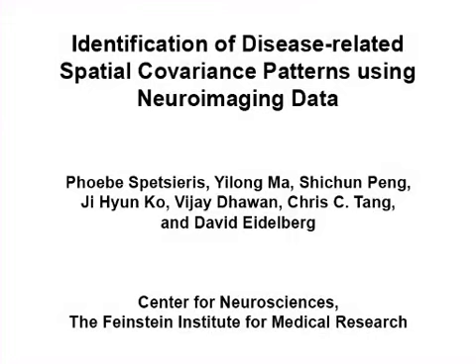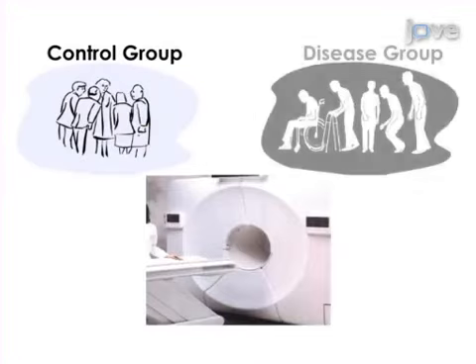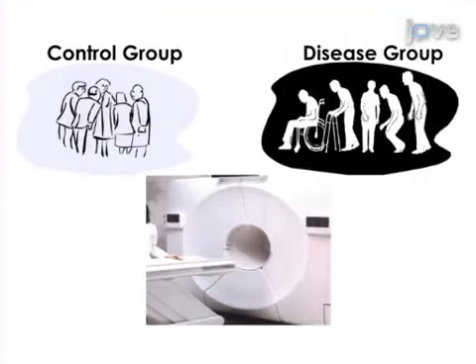The overall goal of this procedure is to determine signature covariance pattern imaging biomarkers of neurofunctional brain disorders. This is accomplished by first obtaining single-volume brain scans of a set of clinically pre-diagnosed patients and an age and preferably gender-matched set of normal controls using modalities such as PET, SPECT, ASL-fMRI, or VBM-MRI.